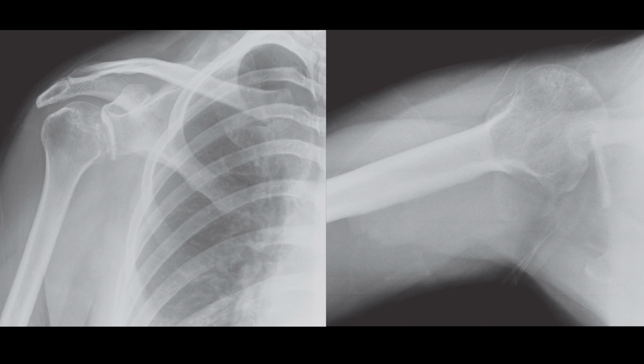All right, let's go through this case in detail. We're examining antero-posterior and axial views of the right shoulder in a skeletally mature patient. The humeral head isn't articulating normally with the glenoid. Instead, it's displaced posteriorly and impacted on the posterior margin of the glenoid. This displacement has resulted in a large reverse Hill-Sachs defect in the humerus.